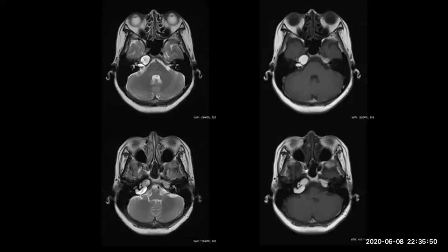And could be chordoma? No, not midline. Chordoma is hypo in T1. Hypo in T1 could be another differential, but it does not fit with our MRI finding.